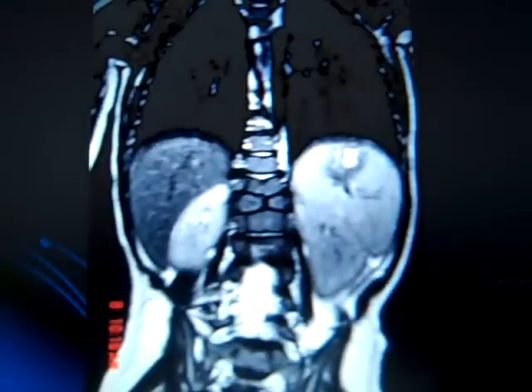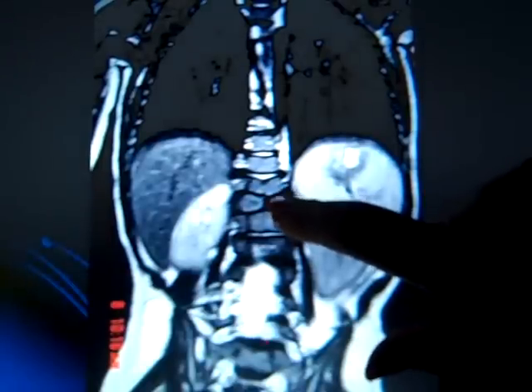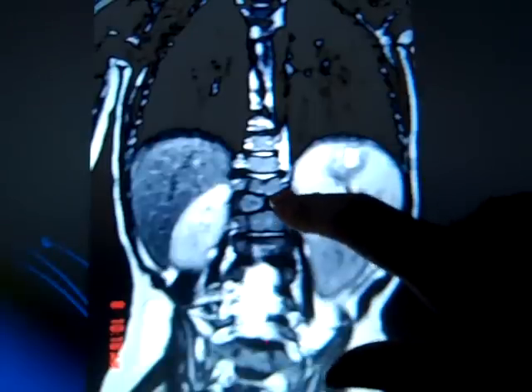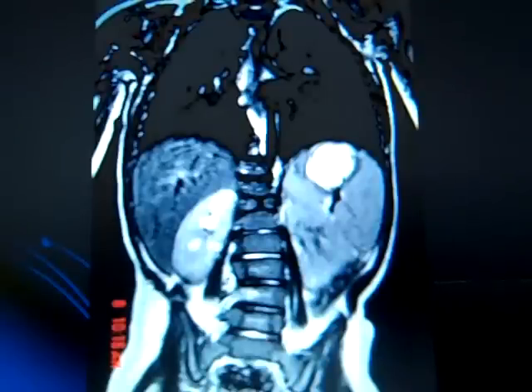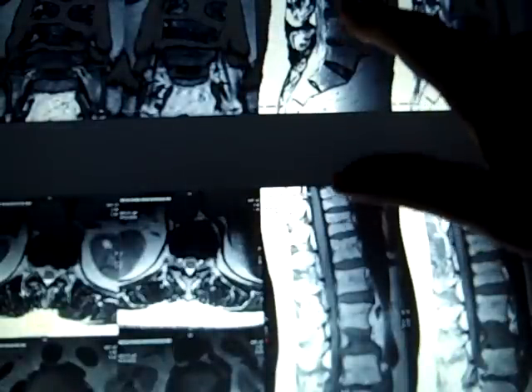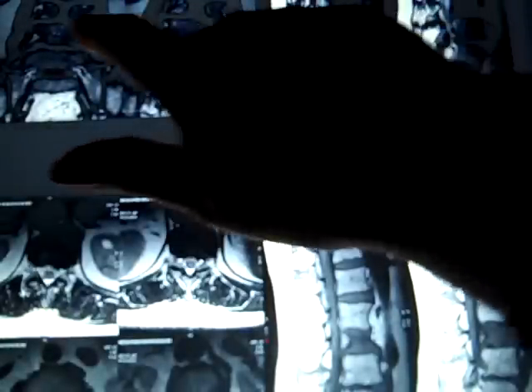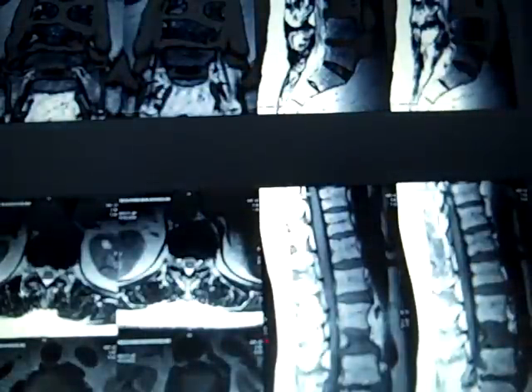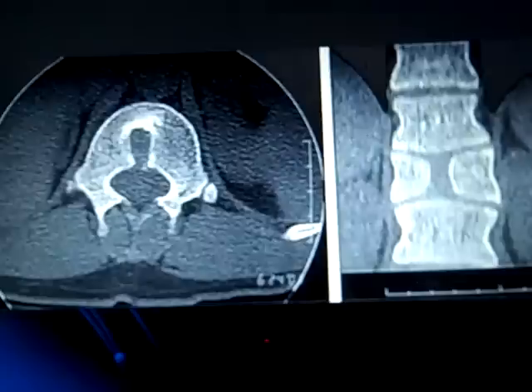I also found some MRI views online for a butterfly. I was just curious myself as to if there really is a gap. And so you notice this one right here, there's the gap, and you see the segment above. Just showing you these, I flipped through some of these on a sagittal plane. See that the gap is truly through the middle of that, and on the coronal plane, looking at it again, I just found that curious for me to look at on an MRI.